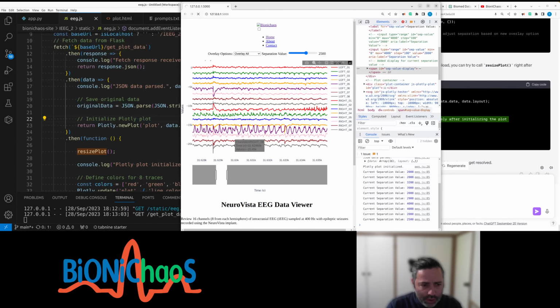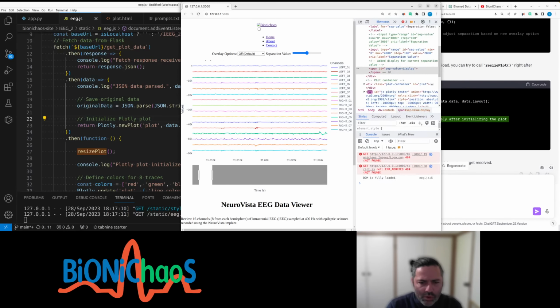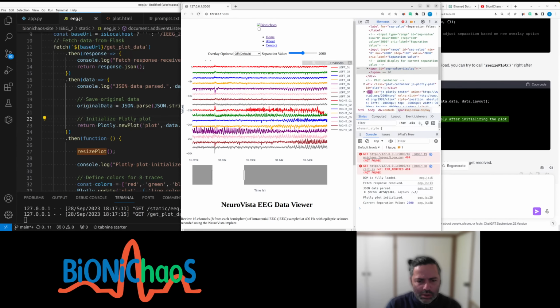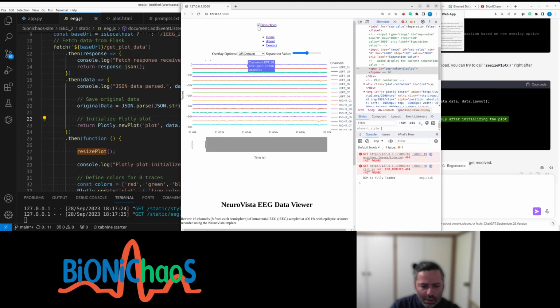solved that annoying thing in the beginning when loading the page. By the way, hopefully this page will become available on the website. Currently there's a bit of a placeholder there.